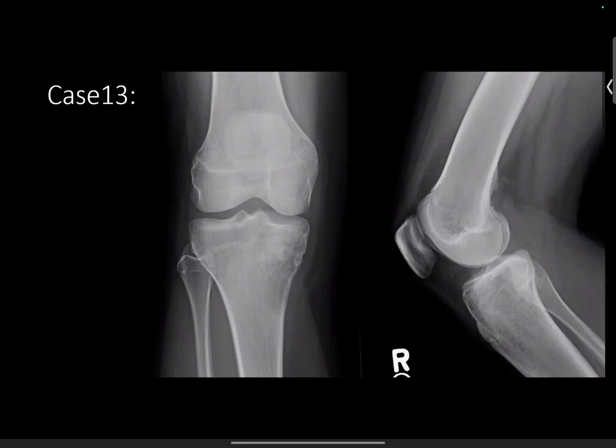As part of the exercise here, not even just making the diagnosis, is for you guys to look at this and say, this is a malignant appearing lesion. We don't have periosteal reaction, but we know this is something malignant. And this ended up being an osteosarcoma, but just to show you that this is a malignant lesion, even if you don't know what it is, you don't want to let it go.